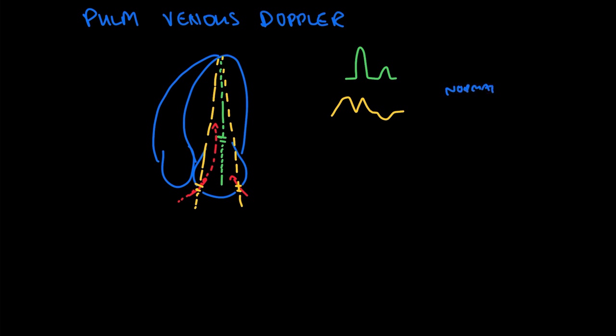And what if we have impaired relaxation? Well, with impaired relaxation, you've got your E wave, and then your A wave, and actually the atrial kick is providing more of the blood flow into the left ventricle. And again, you'll see in systole, blood will flow into the left atrium, and then in diastole, typically a bit less blood flow will come into the left atrium, and it'll pass right through into the left ventricle. And then during the atrial kick, again, you'll see blood flow reversing. That would be impaired relaxation.